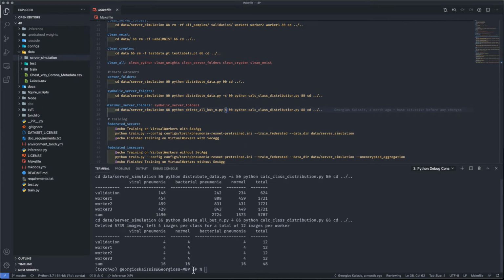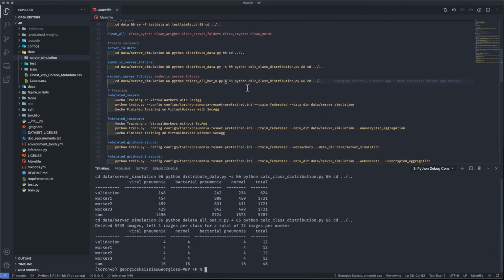that will adapt the amount of images that are put on these folders. So we'll stick with that now, with these 4 images per folder, so we can actually watch an entire training loop. Otherwise, if we train through 5,000 images, this will really take a very long time.